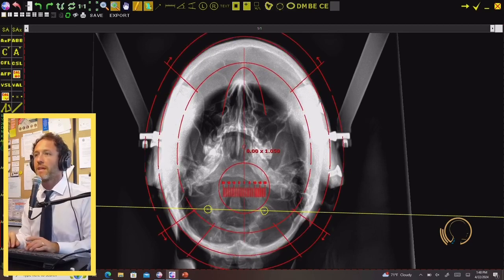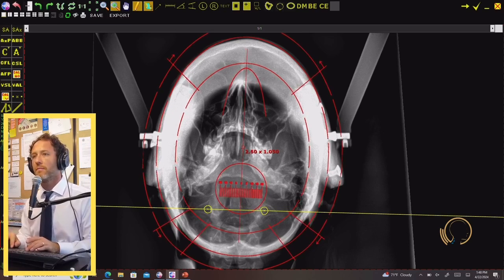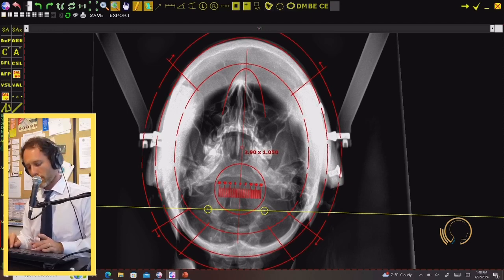And if you have to pick, right, if the skull is just not making sense, you're going with the more lateral margin that you want it to be lined up. Meaning, you get what I mean. And then moving more medially in terms of spacing. So you want the spacing to make the most sense on the sides more than the medial. Okay.